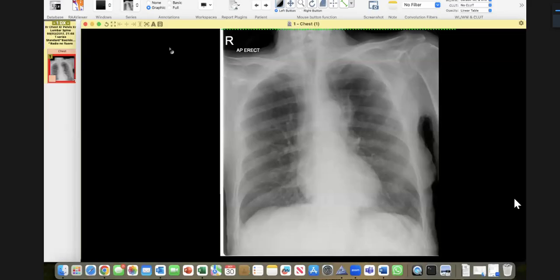So I'm checking the lung parenchyma itself. I cannot catch any striking findings. Both diaphragms are normal. The costophrenic angles are clear. The diaphragmatic areas appear clear. The retrocardiac area appears clear. The breast shadow, is there a missing right breast shadow? No, that's also projectional. Don't worry. Okay, so it appears normal too.